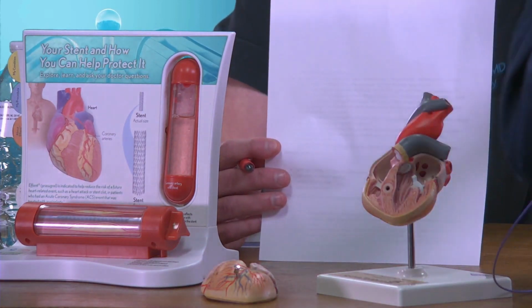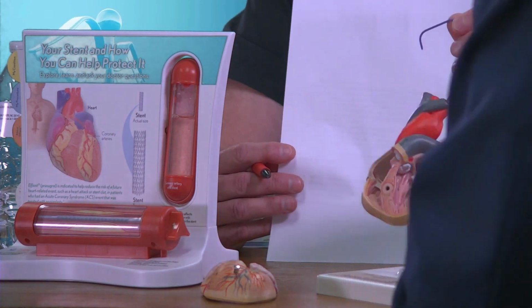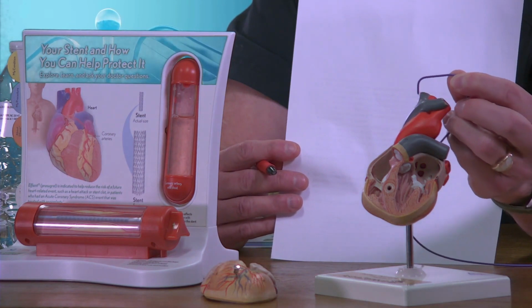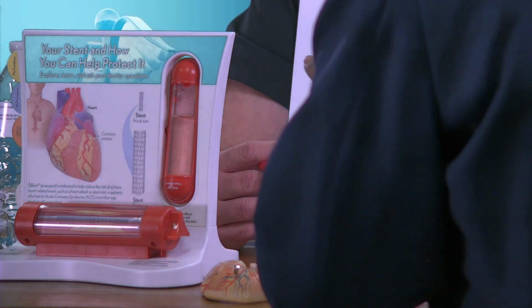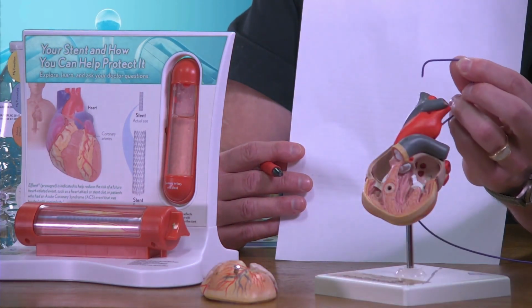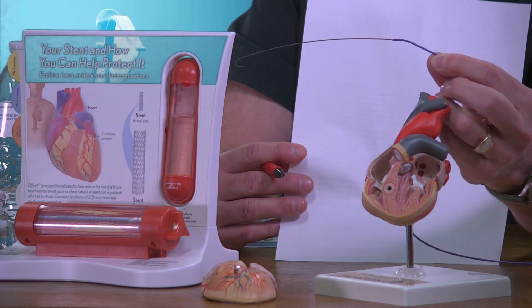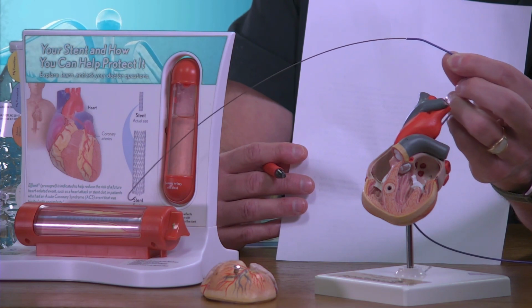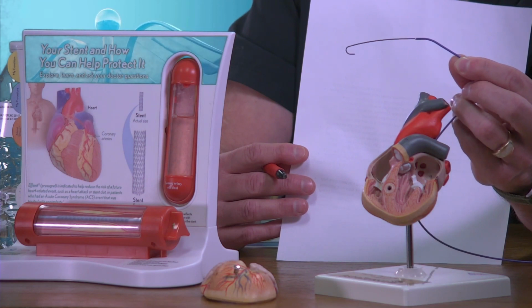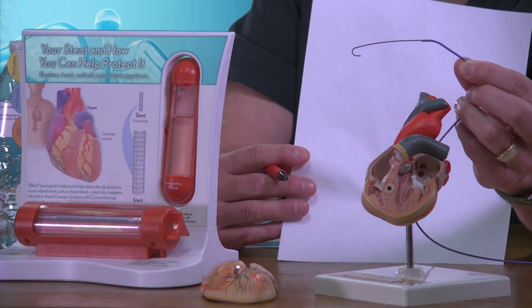So again, let me show. The catheter, and are you ready to thread it through? Don't do it yet. The catheter, so this goes into the vein, and then goes into the artery. Okay, goes into the arm, I'm sorry. And now show us threading it. So this blue catheter, you can't see it as blue perhaps on the TV, and there's a catheter that actually goes in. Okay, do you see that? And so the first catheter takes you to the artery. To the artery. And then what is this flexible wire doing that you just put through the catheter?